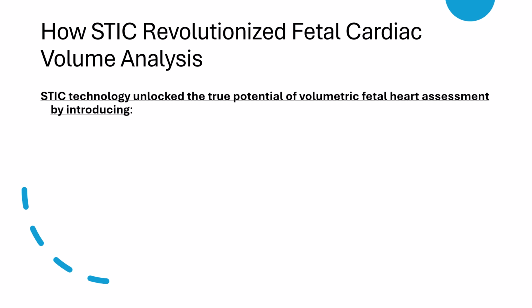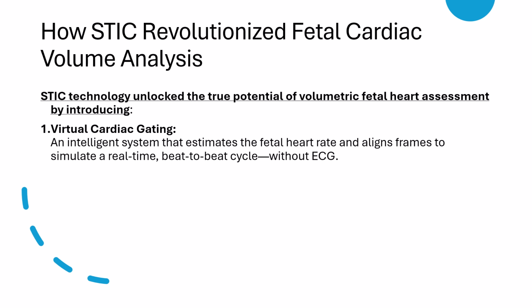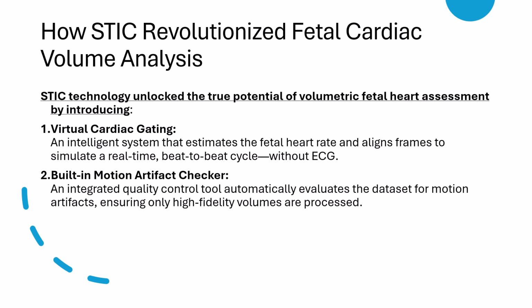This intelligent system allows us to estimate the fetal heart rate and align the captured frames in such a way that they simulate a real-time beat-to-beat cardiac cycle without the need for ECG synchronization. This makes the process more streamlined and less dependent on external signals, all while maintaining high temporal accuracy.